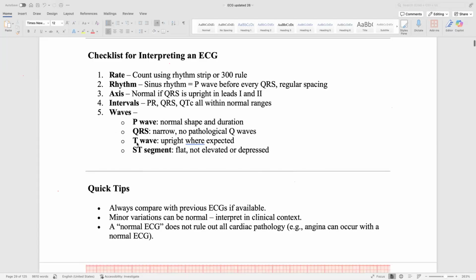So after we know the abnormality, we need to know which leads. And if we detect the leads, what about the other leads? Are they in the same area? Good support.